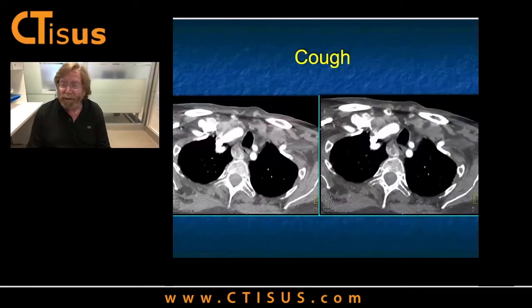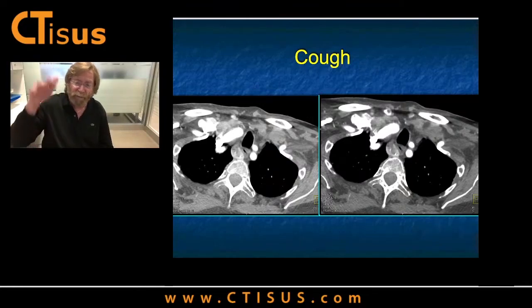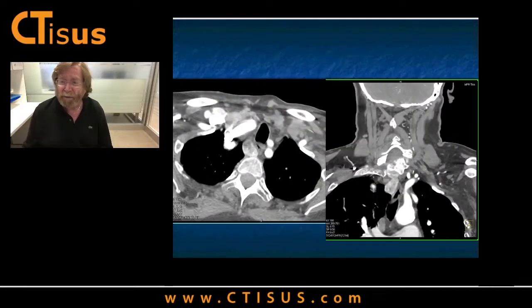Okay, what else can I tell you? A cough. Patient has a cough, got a chest CT. Well, the key finding is, I know you have to look at this carefully, but look at the trachea. There's an enhancing lesion posterior to the trachea to the right, and there's the esophagus. Now maybe it's an esophageal tumor. It could be like a leiomyoma, which is enhancing. That's a possibility. Could be substernal thyroid coming down. I didn't give you all the images. That's definitely a possibility. But here now I've given you all the images, so you recognize it's not substernal thyroid.